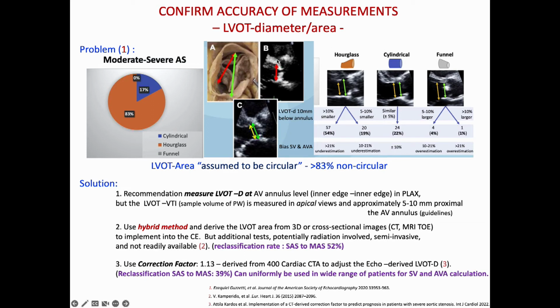The other problem is that the parasternal long axis view that we are measuring the aortic diameter from is an oblique short diameter of something that you can see here in red. But once we have acquired it, that's the number that we can use, and we can calculate the LVOT area. You can probably appreciate how vulnerable this diameter is to derive the aortic valve area from.